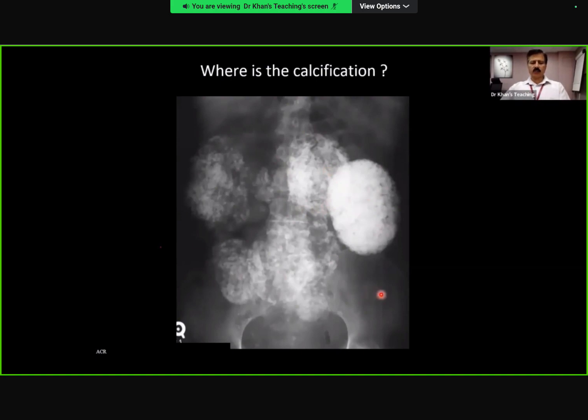Where is this calcification? This is just to develop your eyes. Intraperitoneal. You see, it's very well defined. It is within a viscera. This is what we call a visceral type of calcification. So then looks like within the gut. Something which can be so large among the viscera.